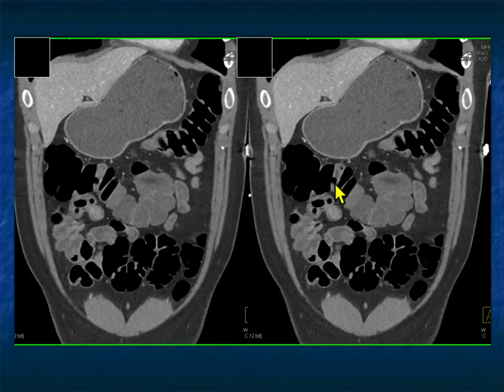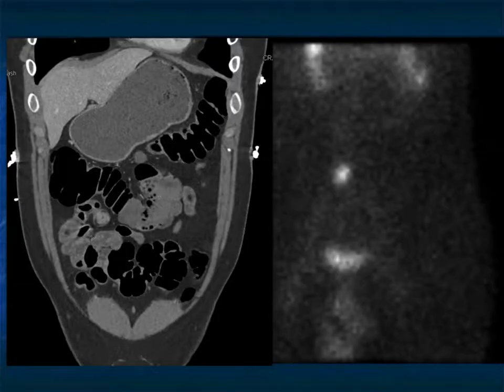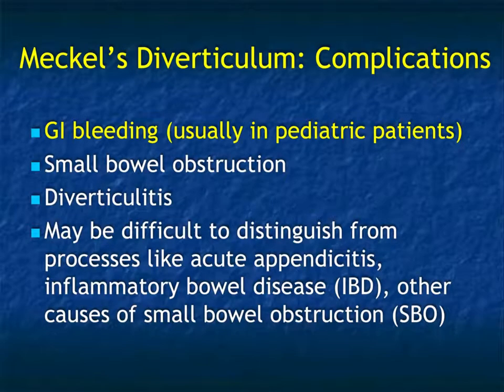This is always a tough diagnosis, though the coronal gives you a better feel because it's kind of coming off the small bowel, but it's just kind of sitting as a circular, high-density structure. When you do the volume rendering, you can accentuate it. Could this be a tumor, an exophytic GIST? That's a possibility. But younger patient, great location, exophytic, think Meckel's diverticulum, and here's a Meckel's scan.